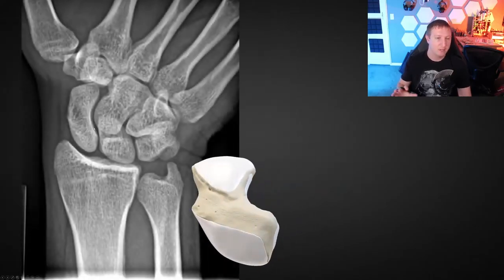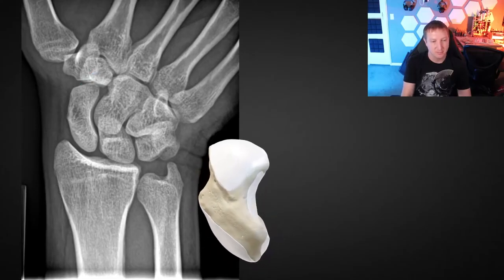All right, and I mentioned we will often do a supplementary ulnar deviation view, and part of the reason for that is that it allows us to see the scaphoid better. This is the native position of the scaphoid, which I showed you on the first slide, where it's tipped forward a bit. But when we ulnar deviate, physiologically we apply stress and pull it into more of an upright stance like this, and it allows us to see the waist laid out really nicely, which is the most common place we'll see a scaphoid fracture.